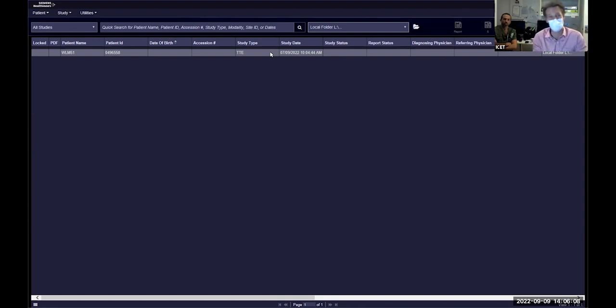She was short of breath. This was sudden onset of shortness of breath with these acute ECG changes. We'll just go through the study, which was performed in the ED an hour or two after presentation to the emergency department.